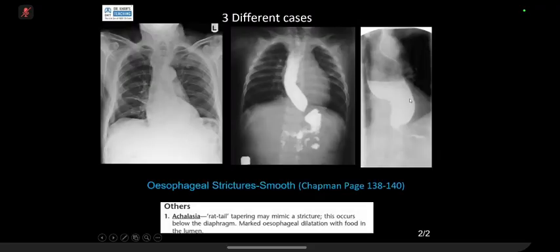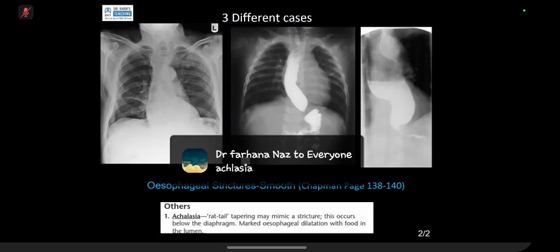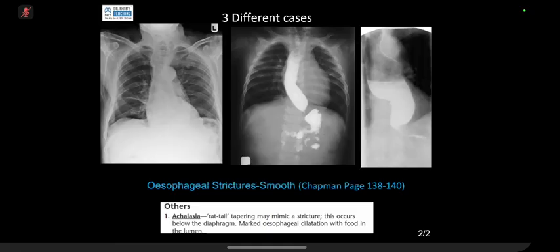This is achalasia, right? Achalasia is a spectrum of motility disorder. These patients present to you with a chronic condition, and they develop a megaesophagus. It can be like this. Basically, it's a motility disorder at the distal end. Please remember, the basic idea is that muscles are contracting and the sphincter is relaxing. So in motility disorder, something is wrong in that spectrum. Even that tertiary contraction was part of the motility disorder.